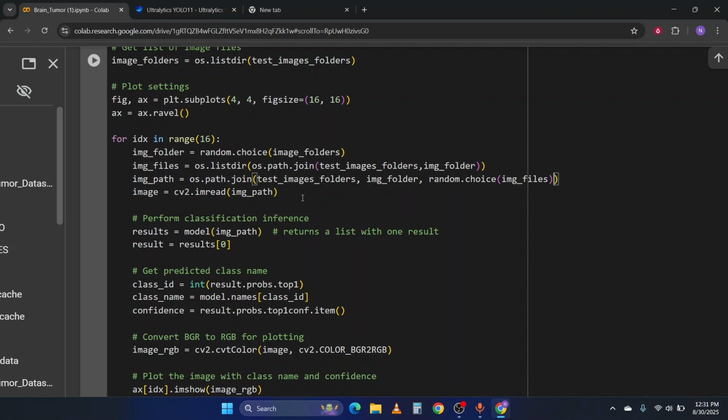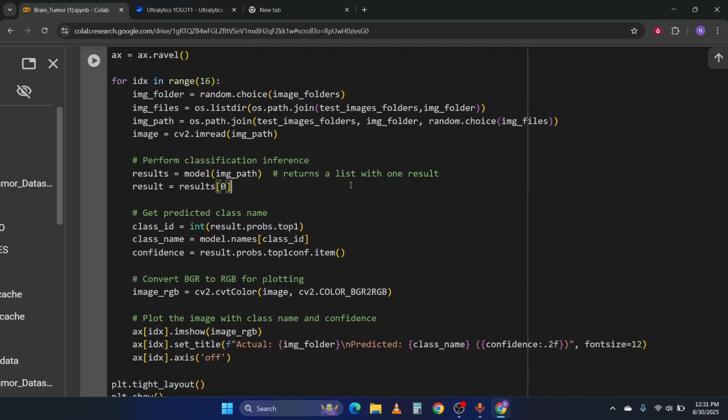Now we have to read the image. Just pass the image path. You can either pass the image directly after reading it, or you can pass the image path. No error will occur. Both will remain the same, both will be okay. It's up to you what you will do. And just wait for a minute. It can be converted into this. Okay, it should be like this. There is no difference, but like this.